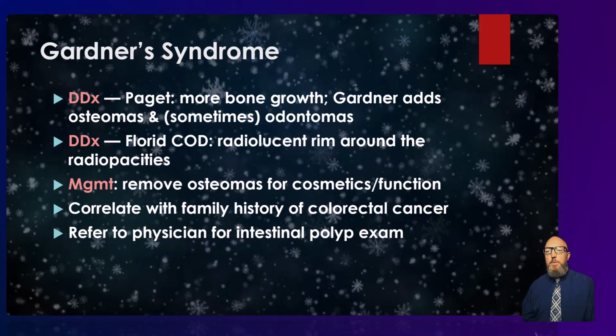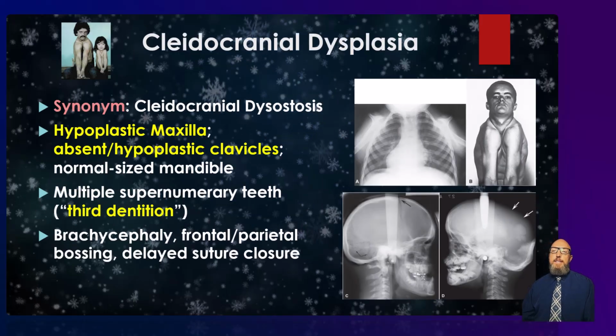To notice the osteomas and say nothing is to miss the entire point of the diagnosis. And so this is really important for your patient's safety, could affect their lives. But let's go on to the second suspect, the cleidocranial dysplasia, also termed cleidocranial dysostosis.